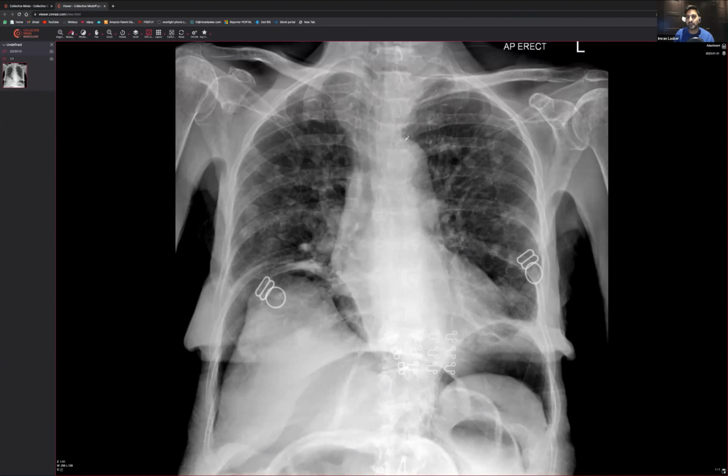Okay, so then let's have a look at the aortic knuckle. That's over here. That looks okay. Lung apices. Remember before, we want to make sure there's no subtle pneumothorax. The way to do it is to draw that little square there. Make sure that we haven't seen any abnormalities anywhere. So yeah, someone's got it. Well done. So then put a little square there, put a little square there as well.